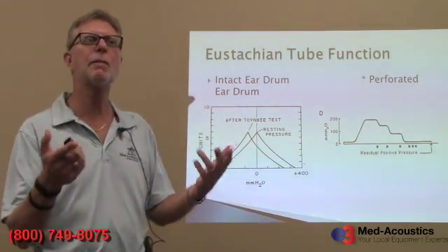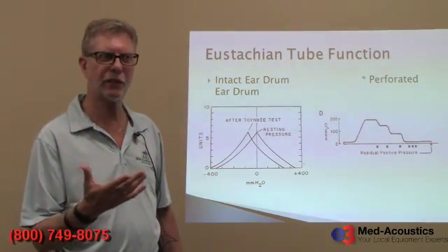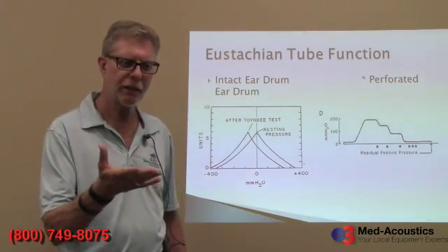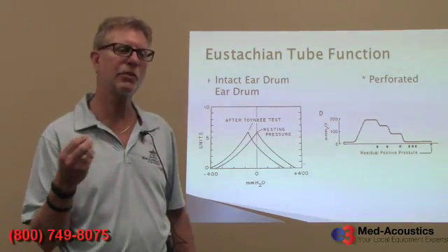So these are the common functions of a clinical middle ear analyzer, like the new Timstar Pro. Other things, like I mentioned before, like reflex latency, can be available on this type of unit, and even multi-frequency tympanometry.